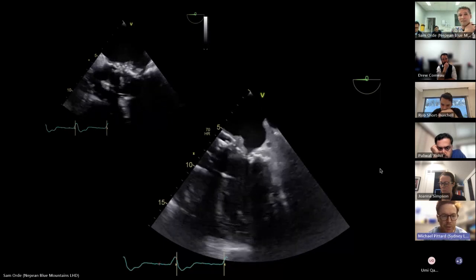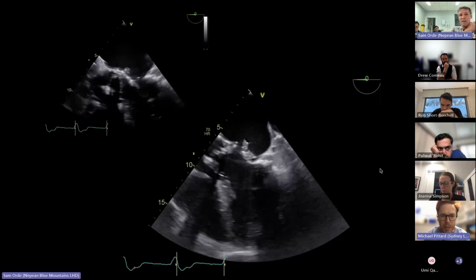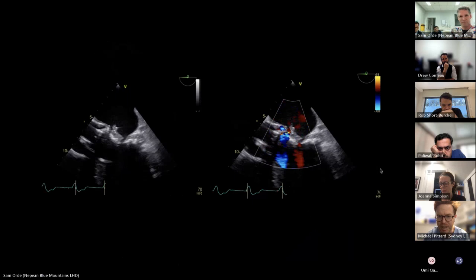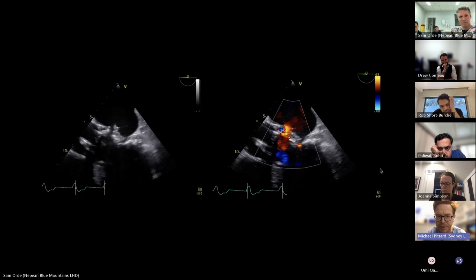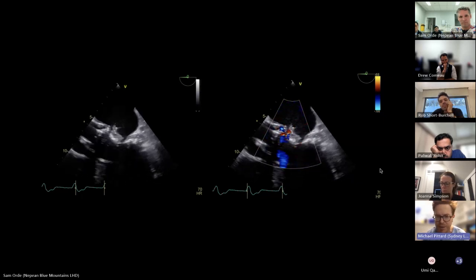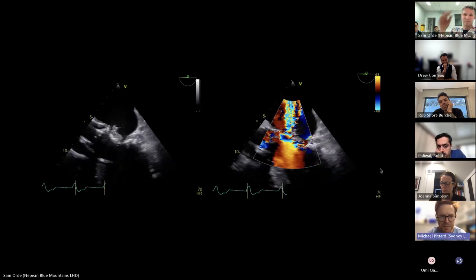Which of the mitral valve? Yeah. Is that what you're talking about? The anterior mitral valve leaflet? Yeah, and which probably at A1. Okay. You can see on this color Doppler that there's an obvious defect in the base of the leaflet insertion of that anterior mitral valve, probably at A1, as well as some. Yeah, that's what I can see.